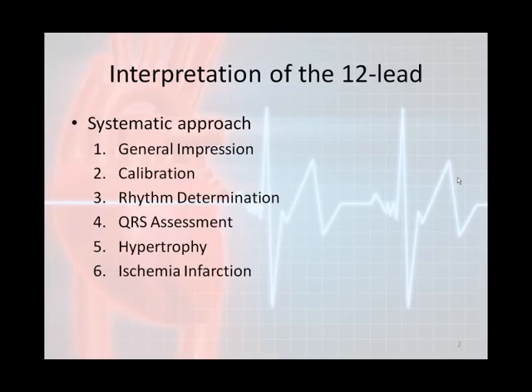If you know how to interpret multiple anomalies, then you would look at the 12-lead EKG and the general impression in Step 1, and you would immediately see the ugly morphologies consistent with myocardial infarctions. If you notice this, you should immediately treat the patient based on their symptomology. You should not have to go through all 6 steps to figure out that the patient is having a heart attack.